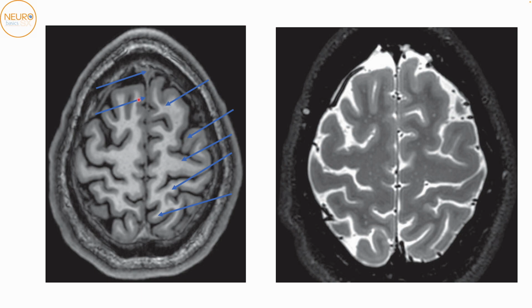and then going down inferiorly. So, the different structures that we can identify: this right here is the superior sagittal sinus. This is the falx. Okay, and this is quite a high up image. And the higher up we are, the largest part of the brain will be occupied by the frontal lobe.